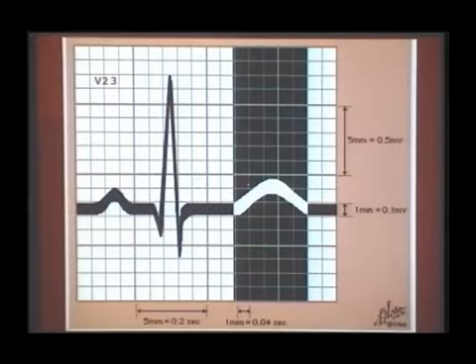Whenever your T wave is not satisfying these two points, either it is not going in direction with the QRS, or the amplitude is bigger or smaller than the QRS, it is abnormal. So the T wave represents ventricular repolarization. Whenever the QRS is upright, it is upright. It is measured in V2 and V3, where the T wave is nicely seen; you have to measure the amplitude. There is no duration of the T wave.